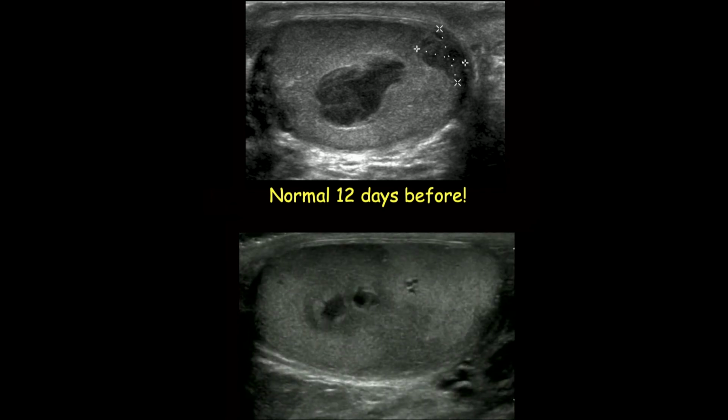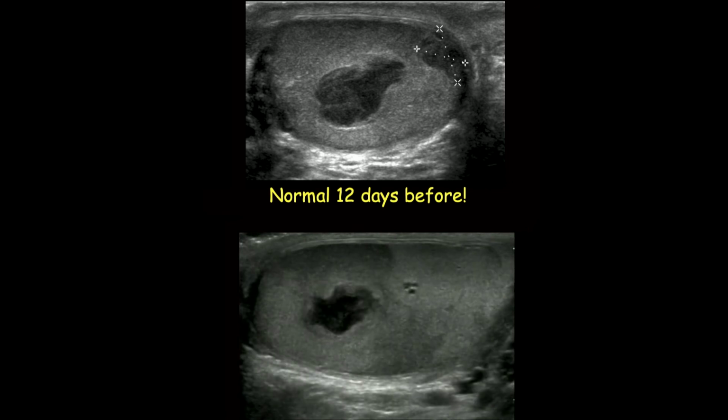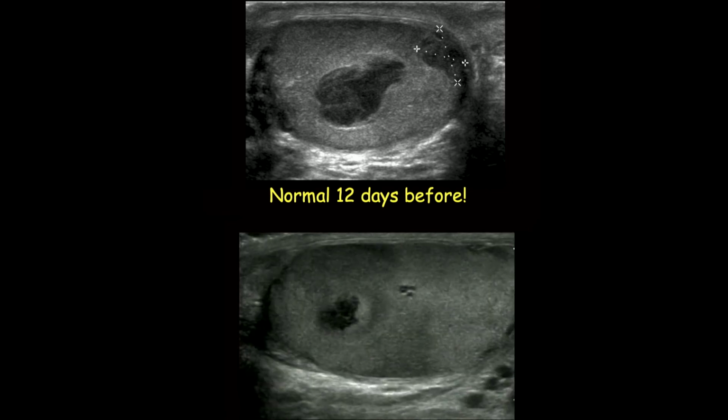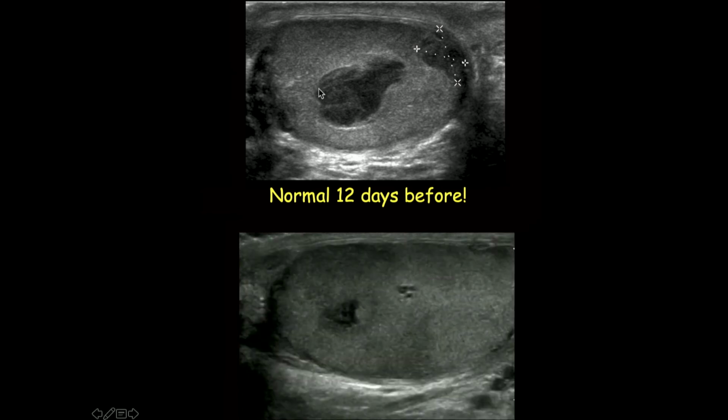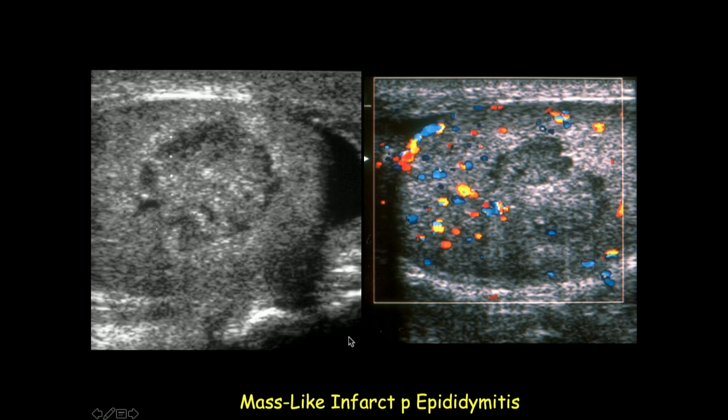Young males have testosterone poisoning, as one of my friends says, and they don't like to take antibiotics or follow rules. So normal scrotal ultrasound 12 days before, didn't take his antibiotics, shows up 2 weeks later with an abscess. I've got a million cases like this.